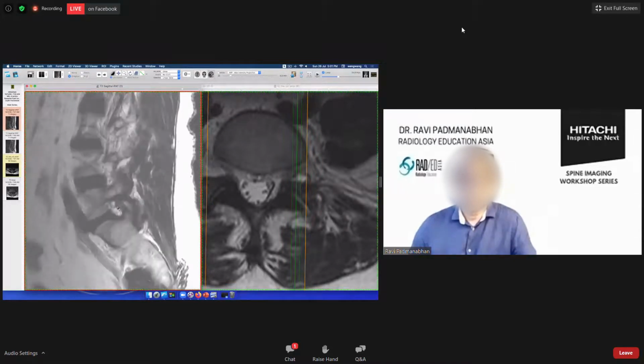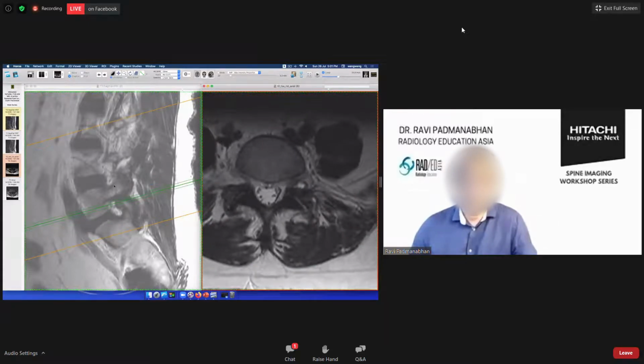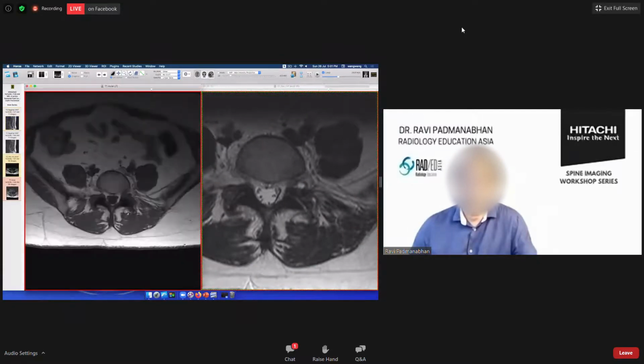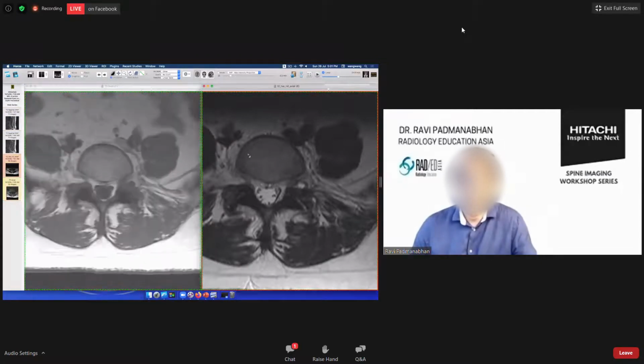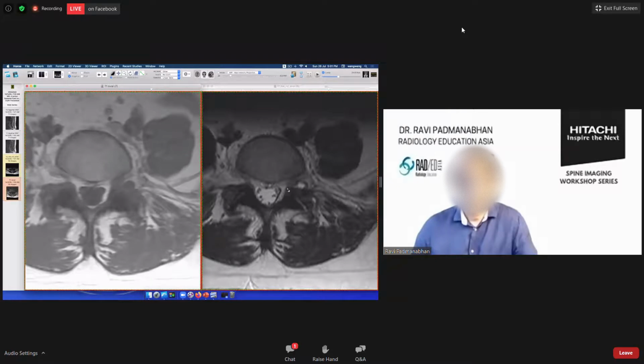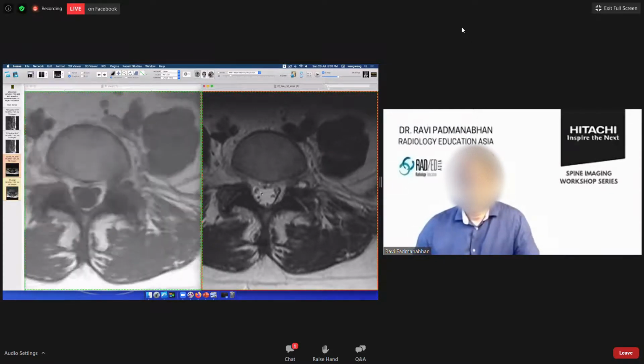So we have a small cyst. We've said that we've got a cystic structure. Let's look at the T1. Again, it's important to look at the T1 and compare signal, to make sure that it is fluid signal. Okay, so it's low signal on T1, high signal on T2, slightly septated, sitting within the foramen. So all of these things fit for a facet cyst.